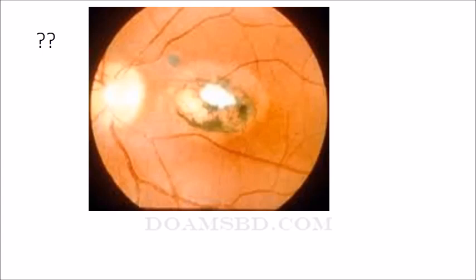Maybe extensive damage happened by the toxoplasmosis in the wall of the eye, right? If you say retinitis, only retinitis. If you say choroiditis with retinitis, choroidoretinitis, you find that the sclera is also visible. It may be a feature of toxoplasmosis, but we should not be confident. We can diagnose toxoplasmosis with other features.